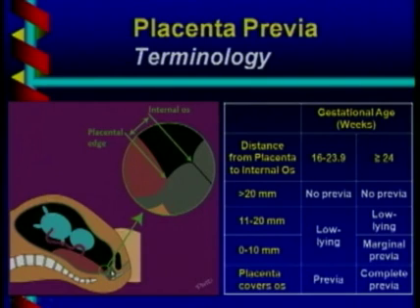What's key in terms of our diagnosis is a close-up view of this area, the relationship between the placenta and the cervix. So here it is blown up right over here on this image. The gray area here is the cervix. The dark line is the cervical canal that's closed.